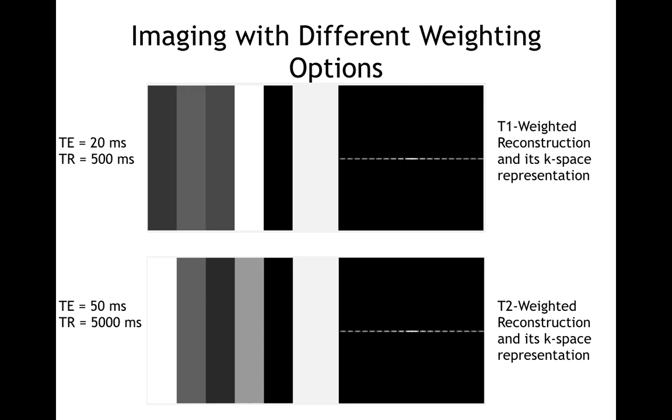This is because water has the highest T2 constant, meaning that it takes a long time for the signal coming from water to decay. Muscle and liver have lower T2 constants, therefore their signals decay faster compared to water and fat. As I said before, the signal coming from protein decays immediately, so it appears dark on the image.